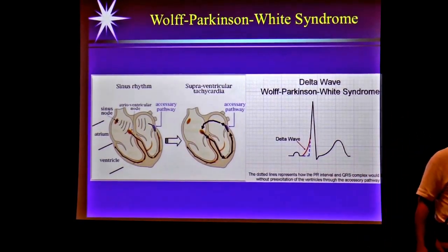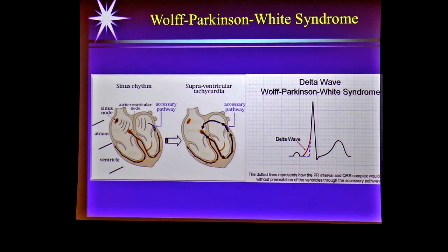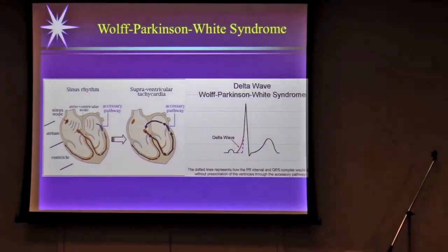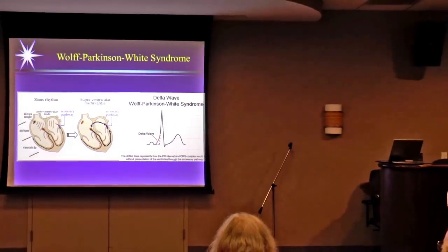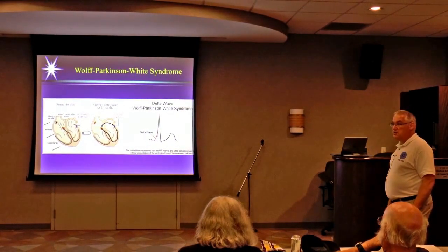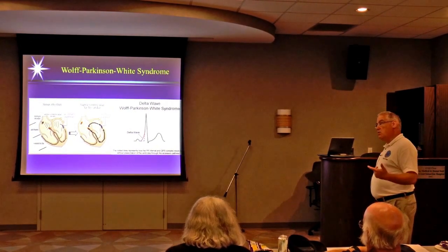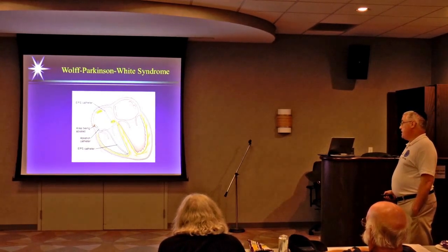Great test answers, and when the rhythm is 200, do you see any of that? No. All mushed together. So it doesn't really help us as far as our EKG. It's more of a test question. The other thing is, do you think the QRS is going to be narrow or wide if they have this kind of crazy depolarization? It's actually wide because, again, it could depolarize outside of the normal pathways.